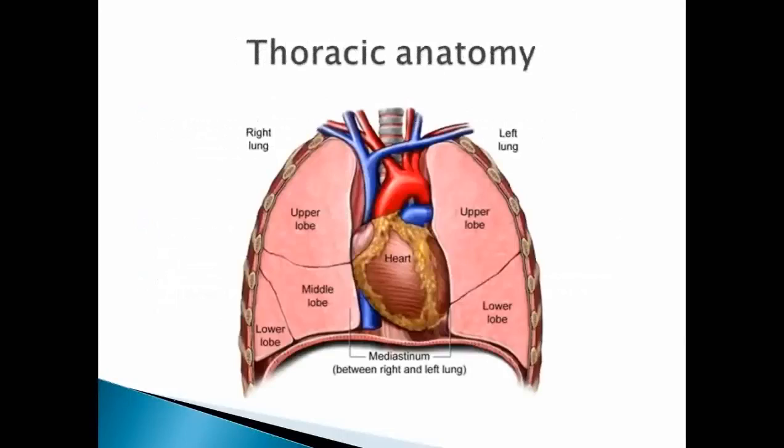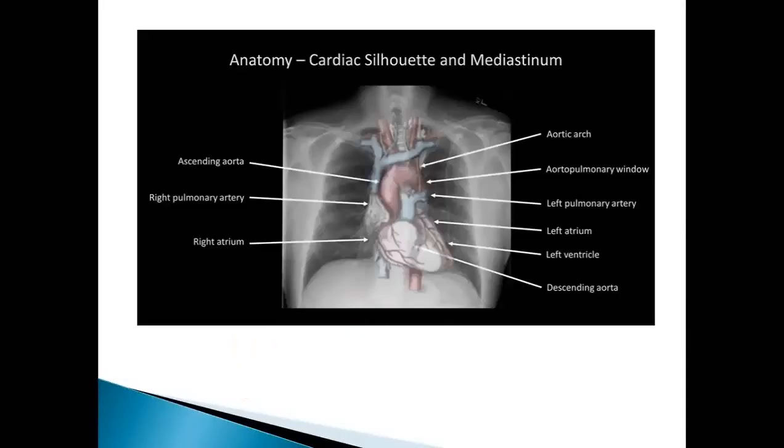Okay, so this is just an overlay of the anatomy over a chest x-ray, so you can see where everything's going to be. You'll also see I have a YouTube video embedded in this lecture that's going to go over a little bit more of this. In fact, it looks like they have similar pictures that I have that we got off the internet, but they're going to actually show them and then make them disappear with just the arrows, things that I don't seem to know how to do quite on the computer yet.